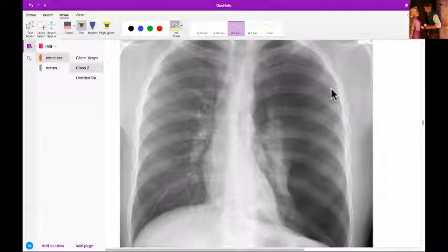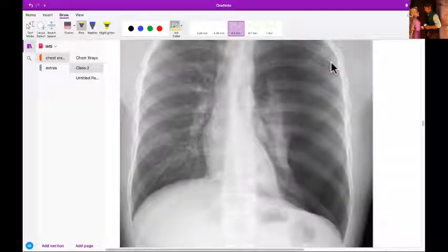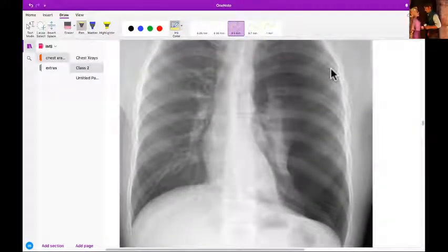Yes, yeah. Okay, but what else? Something we learned in last class. The diaphragm is, what is it? What is happening to the diaphragm? And I'll just show the whole X-ray. Left lung collapse, correct, but bigger than that, more important than that.